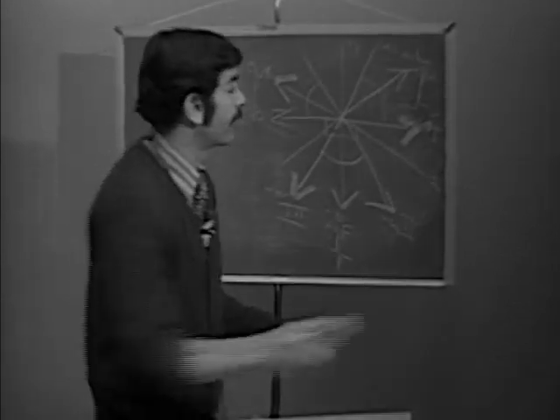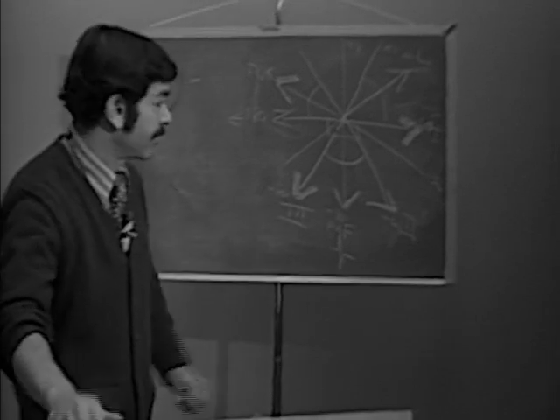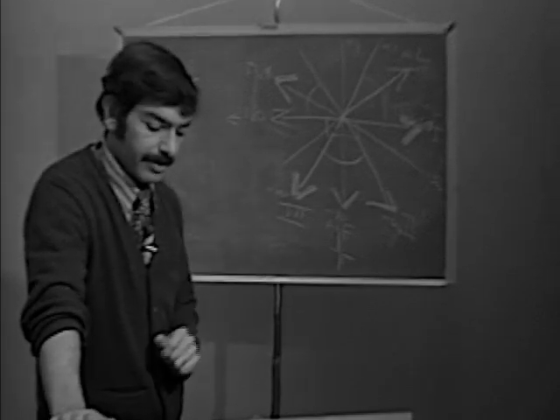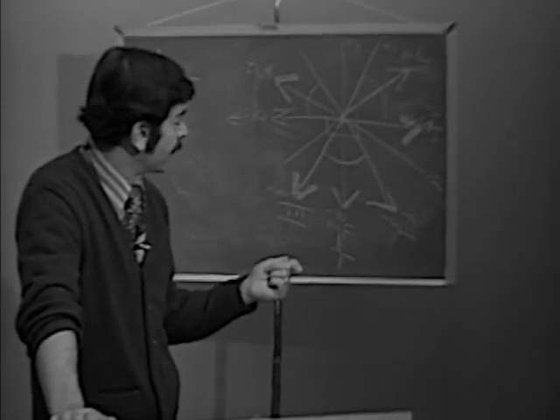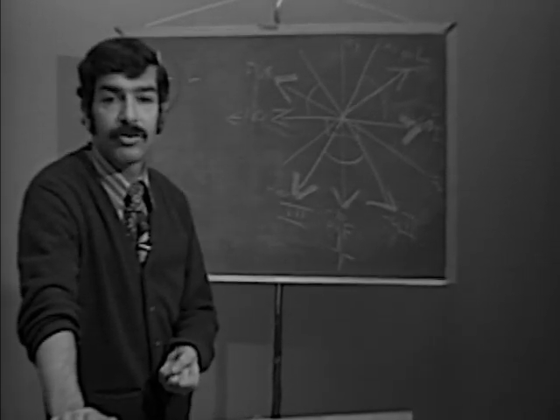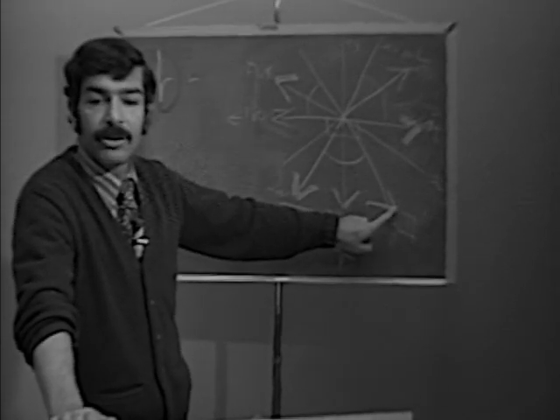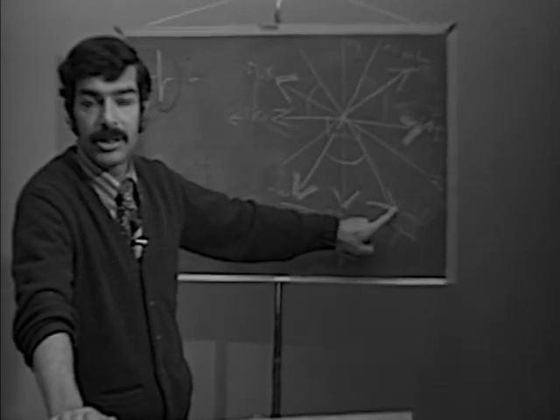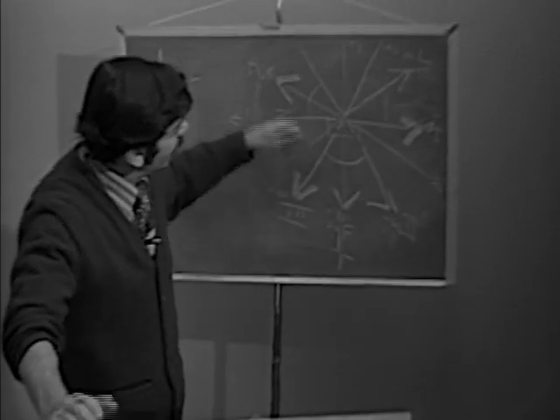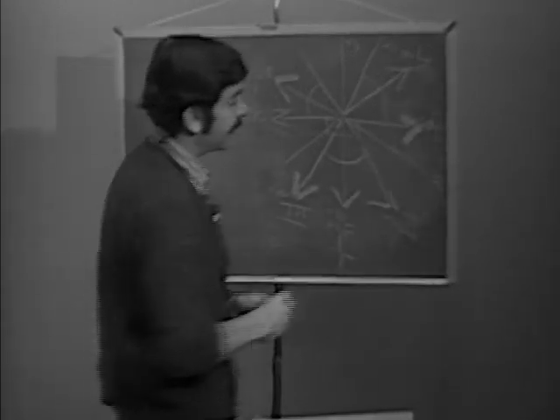Well, let's just take a few examples and see if we can get this to settle in, if you're not familiar with it. Let's make believe we have an electrocardiogram that we're looking at. The electrocardiogram is isoelectric in lead 2. Okay, so the next thing I ask myself is, what lead runs at right angles to lead 2? And I look over here and I can see this is the isoelectric lead. Lead 2 goes like this, and at right angles to that is AVL.